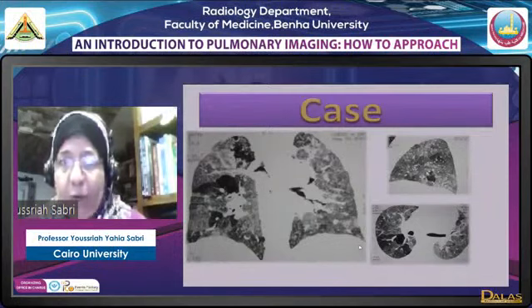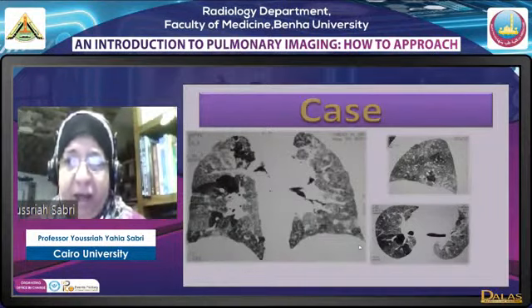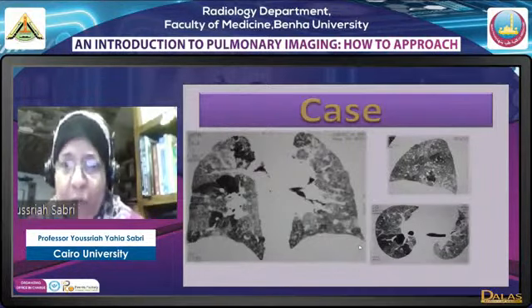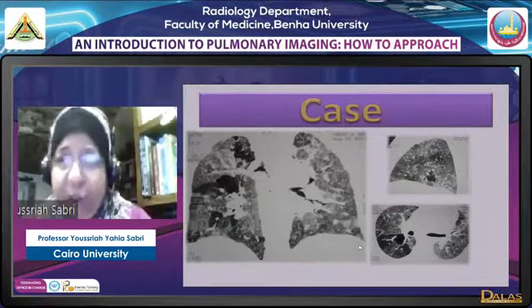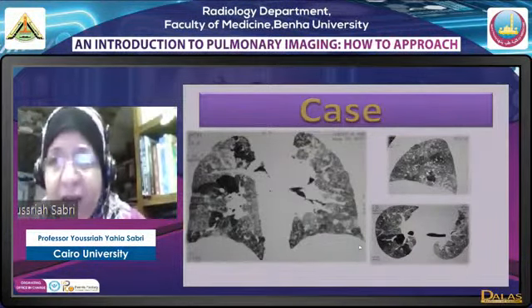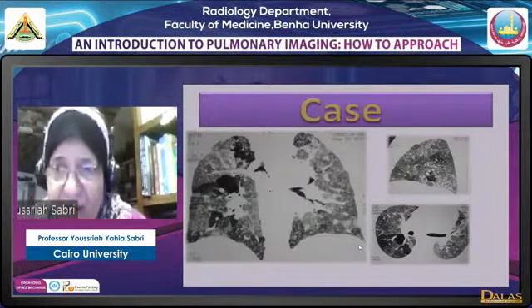Later on, what we see is actually bilateral mosaic pattern with predominating ground glass opacification, intervening areas of lucencies that represent areas of hypoperfusion or aperfusion, and areas of normal lung with relative basal sparing. Subacute hypersensitivity is a radiological diagnosis because clinically it simulates any other interstitial disease. The patient is coming with chronic dyspnea and dry cough.